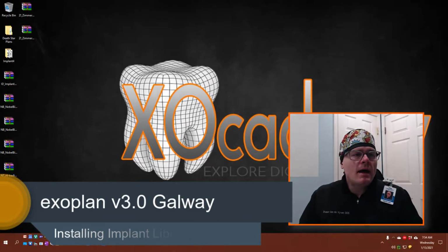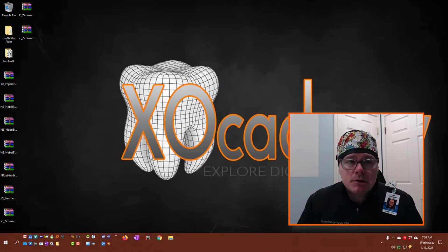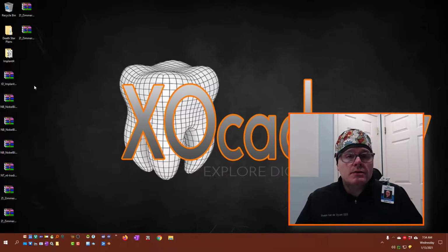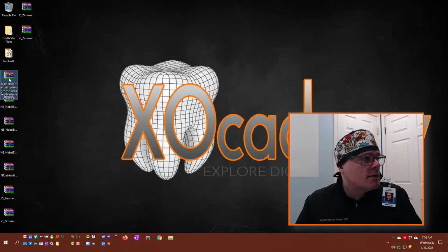So now that we have selected the implant libraries that we'd like to use and we've downloaded them from the exocad website, the exocad portal, we need to install those libraries into our exoplan folder. So here are the zip files that I've downloaded, and I'm just going to show you with this one. This is the Implant Direct exoplan generic series of implants.